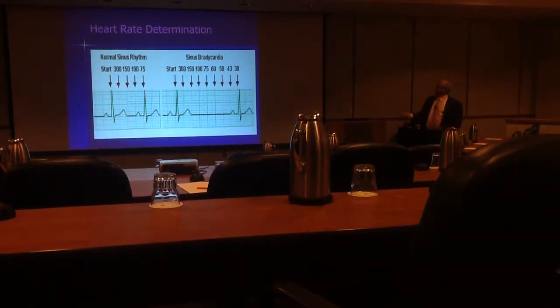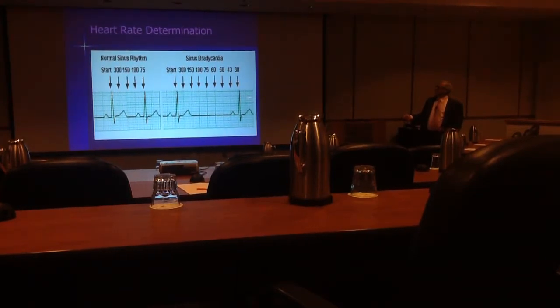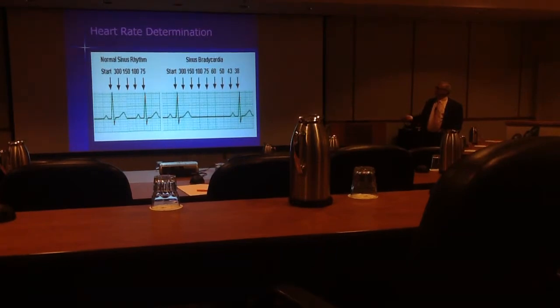Or you can use this 300, 150, 100, 75, 60, 50 kind of device to give you an estimate of what your rhythm would be, what your heart rate would be.